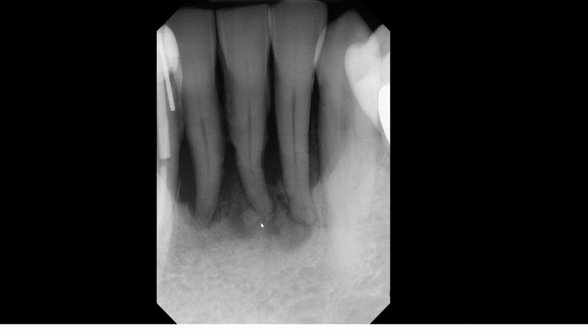So looking at this lesion more carefully, again we see kind of an amorphous radiopacity with a radiolucent rim, and likewise here there's a radiolucent area and radiopaque area. Let's see if we can take a look at the other adjacent periapical radiograph. Again, the same feature is seen here, radiopacity and a radiolucent component.